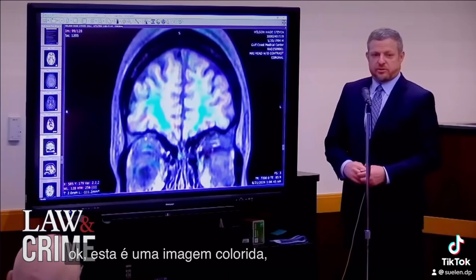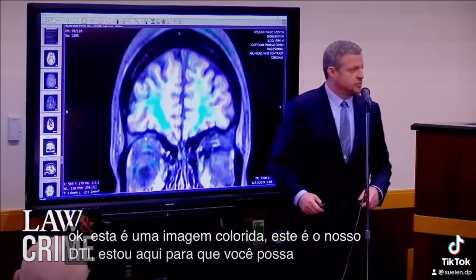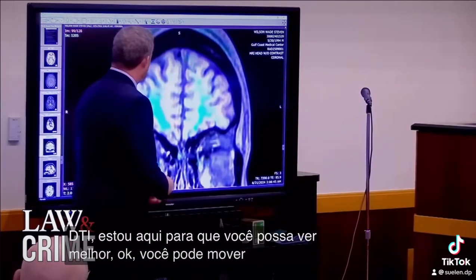Okay, this is a color picture. This is our DTI. Let me get over here so you can see better. Okay. You can move the microphone with you.